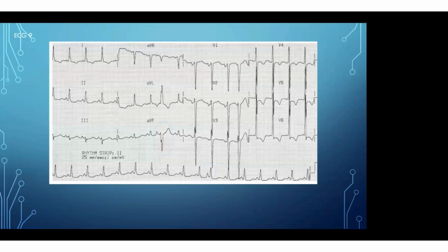So can anyone look at the ECG and diagnose? Can we go one by one with the P wave, like QRS first: rate, QRS duration, whether it's wide or narrow QRS, P wave morphology, PR relation, then intervals, PR, QT intervals.